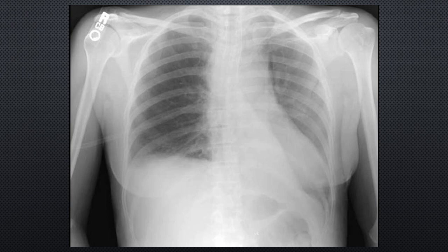And here we have the left lower lobe being collapsed. So if I can convince you that there is a line coming down here, and so this is your sail sign, and it's indicative of a left lower, or whichever side it's on, lobar collapse on that side. So a dense triangular opacity overlying the cardiac shadow is a sail sign. Alright, it's just the fancy term for it.